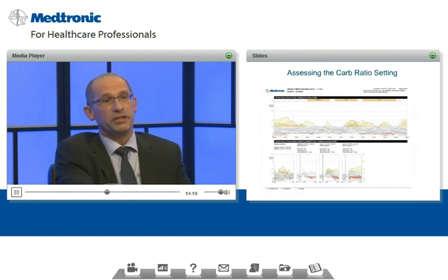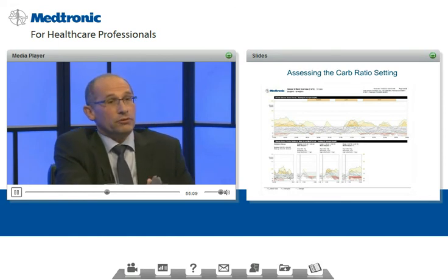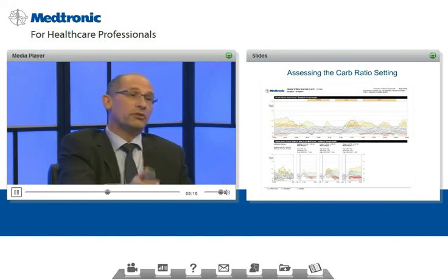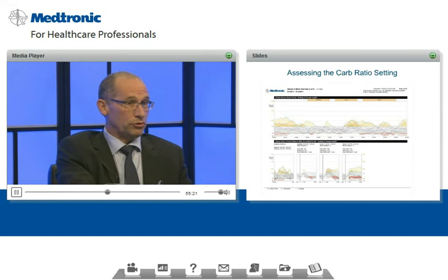At the bottom, it's the insulin, it's the meal data. And in the meal data, they're already organizing for us the statistics on how much the patient's average carbohydrate intake is, how much the average insulin dose is, and by doing the ratio, you can get straight to the carbohydrate to insulin dosage that was used.